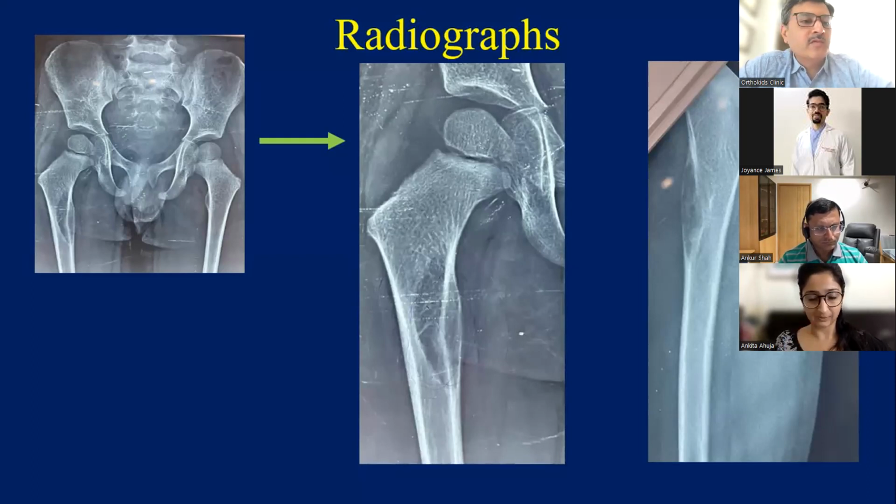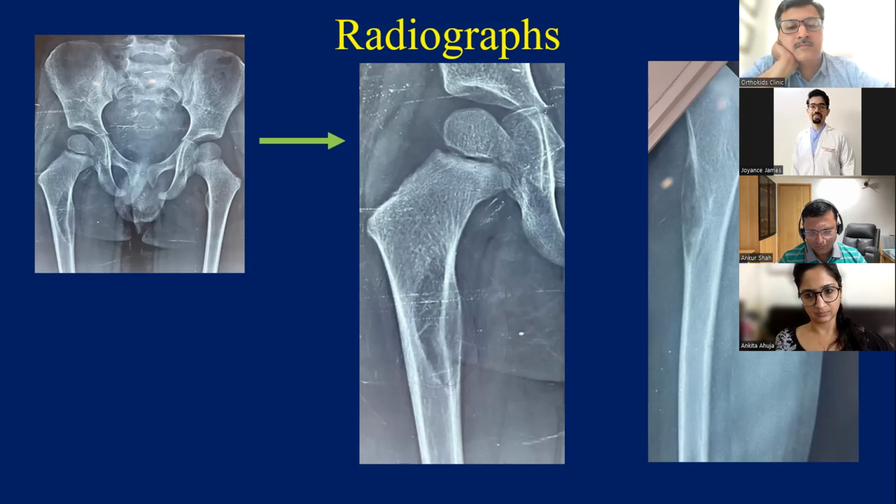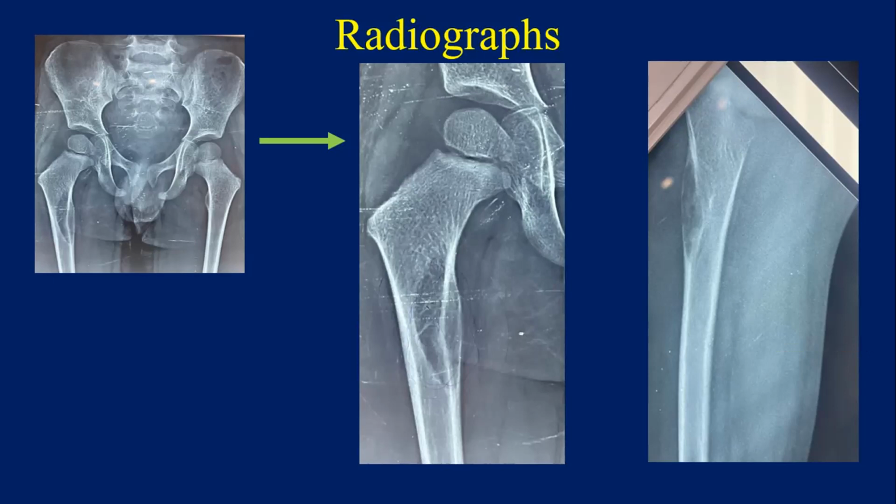Yes, Mandeep, what would you want to say? So this is primarily a cortical lesion. That is what I can see from the X-ray. This is a cortical lesion with scalloping of the cortex on the endosteal side. I don't think there is medullary involvement here, even on the X-ray, because the inner zone of transition is also very sharply demarcated with some sclerosis. So I think this lesion is buttressing the inner cortex towards the medulla, but there is no medullary involvement. Of course, MRI will tell us exactly what it is, but this is what I can see from the X-ray. So that is where you can narrow down your differentials. That's what you say based on the lateral X-ray, I think. Because on AP it looks like it is going in, but there is a shadow.